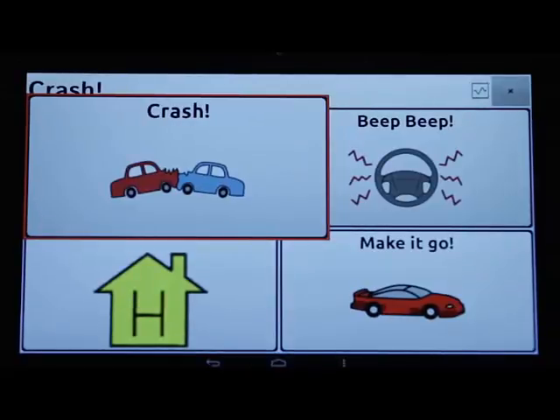Crash. If you want it to speak a button prompt, do not check the option and select Button Prompt, and then select either Speak Label or Speak Message. Typically, we will speak label rather than the entire message.